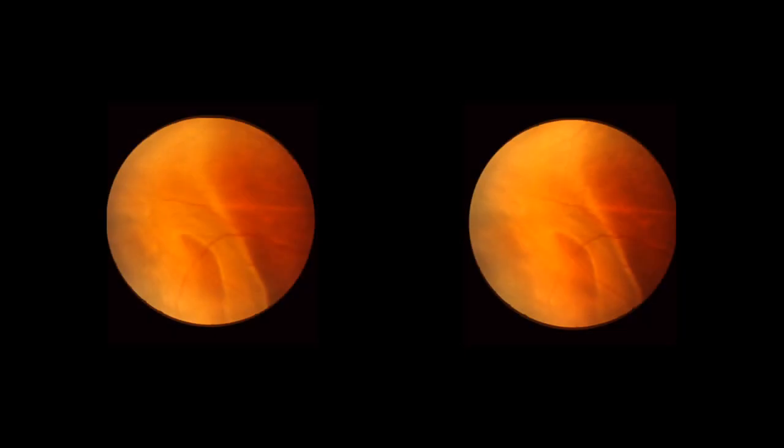The next three photographs will illustrate retinal conditions that can easily be mistaken for retinal breaks. For a fourth example of a pseudo-retinal break, see slide pair 35. It is important to distinguish these conditions from true retinal breaks.